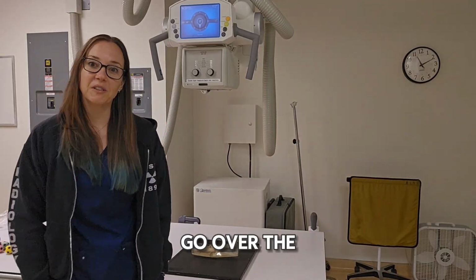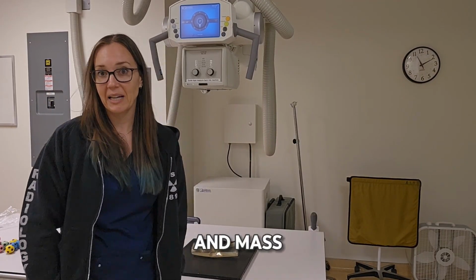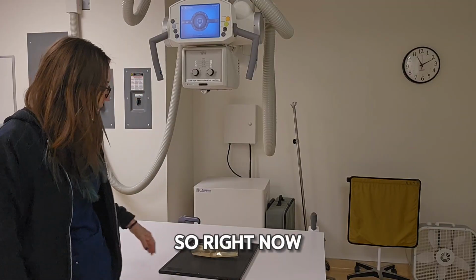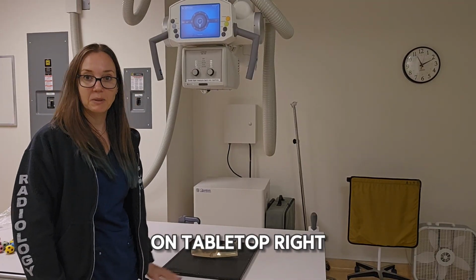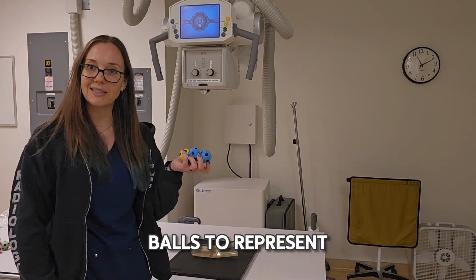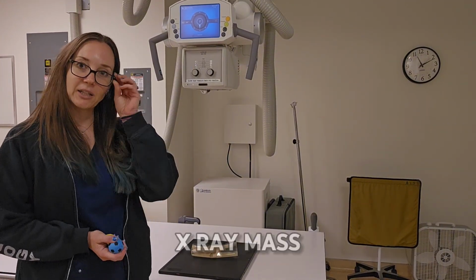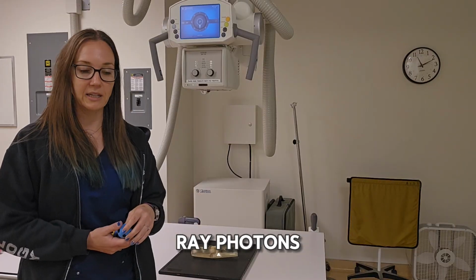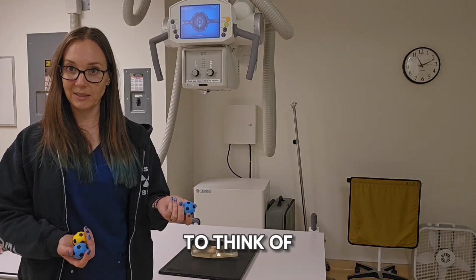Today I'm going to go over the difference between kVp and mAs and the difference between quality and quantity. So right now I have an elbow set up on tabletop, right? And if I use these little balls to represent X-ray, in reality X-ray mAs is going to be hundreds of thousands of X-ray photons. But I like to think of simple numbers, right?